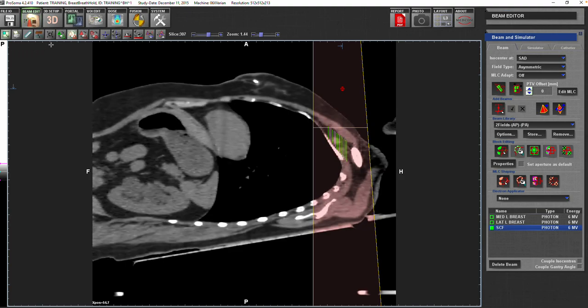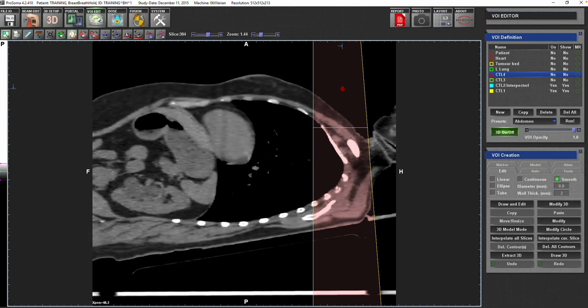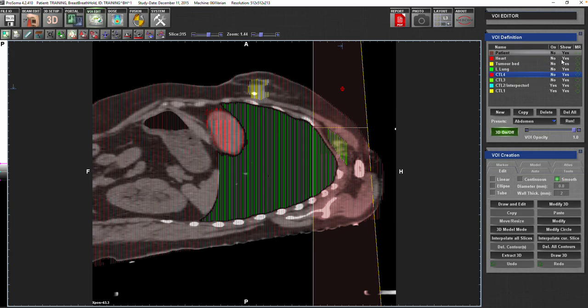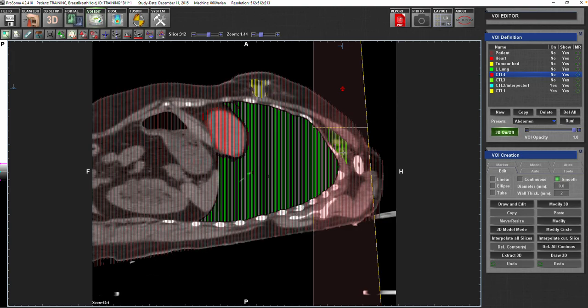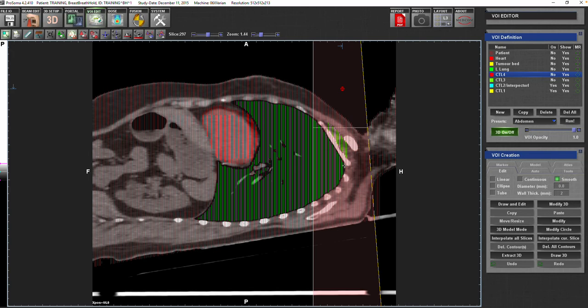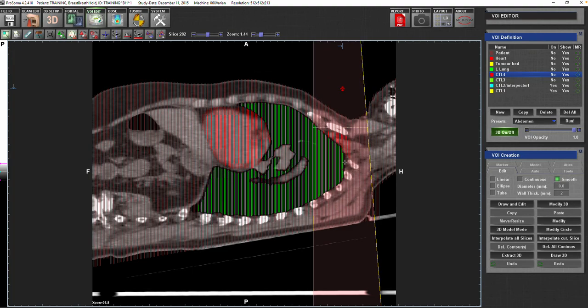If you look at the sagittal view and just remove everything, you can see here the vessels are very clear in relation to each other, subclavian artery and vein. And if I open my structure now, I can see that I'm covering my vessels with a margin. For example, if I'm not too generous, then maybe you can take more cuts. If you think you are too generous, more than half a centimeter or a lot, then you still can remove 2 cuts. But I can see here that my coverage is beautiful, and I'm covering the subclavian, I'm covering the internal jugular, I'm covering the vessels.